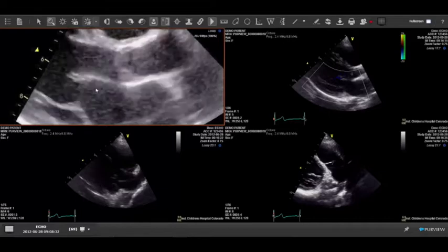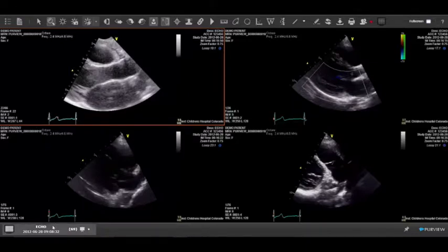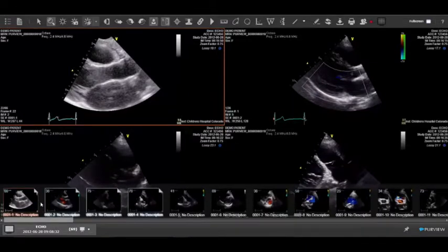The image is in display. We have a number of visual indicators for you. Our thumbnail tray is always at the bottom. You can have that pinned open if you wish. Anything with an orange border tells you it's in display and it's the active series. If you have a blue border around that series, that tells you it's in display but not active. If you see the turned down corner, that tells you you've seen the images within that series. In the left hand corner, you'll see a number. That'll tell you the number of images within that series.